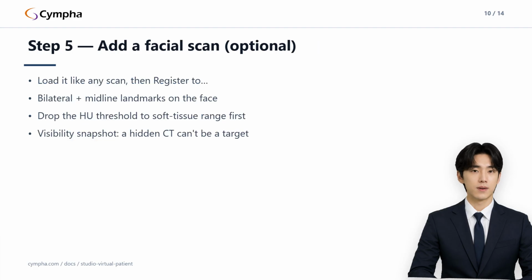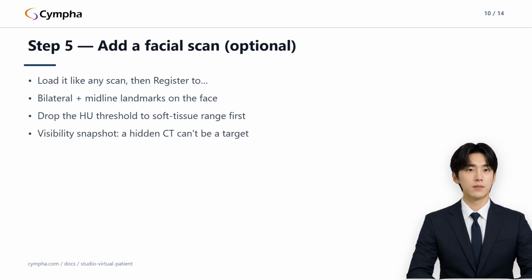Now, the 2-dimensional material. From the hamburger menu, choose Add Pictures and multi-select your reference photos.